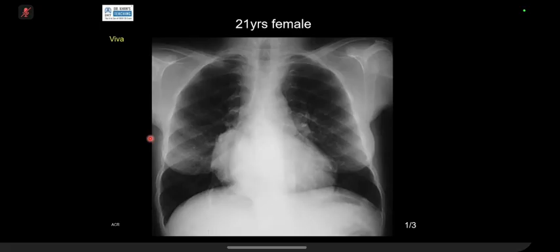There is also a retrocardiac mediastinal lesion, a mass, posterior also, because of the overlap, the cardiac border could be seen. This is maybe extramedullary hematopoiesis with expansion of the bone of the ribs.